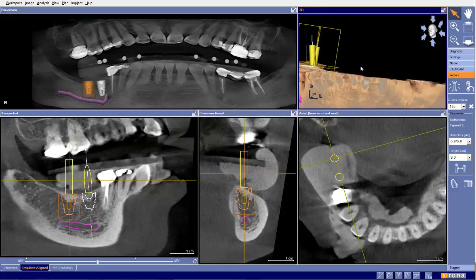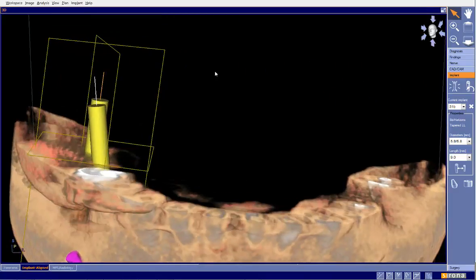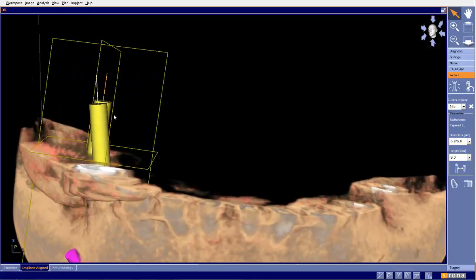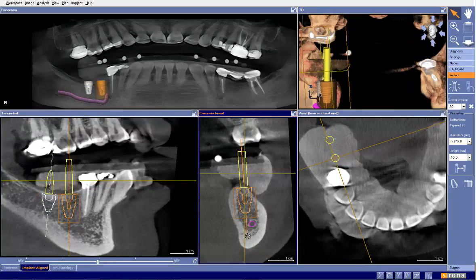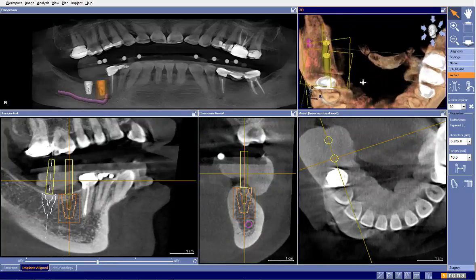And you know, I can see here, this shows me a lot actually. It shows me that of my two implants, one is tilted to the buccal and one is tilted more ideally, and by ideally I mean that lower molar teeth are tilted to the lingual. So more than likely what I would do on tooth number 30 here is go ahead and tilt this from the apex back to the lingual there, and now those are starting to look a little bit better.